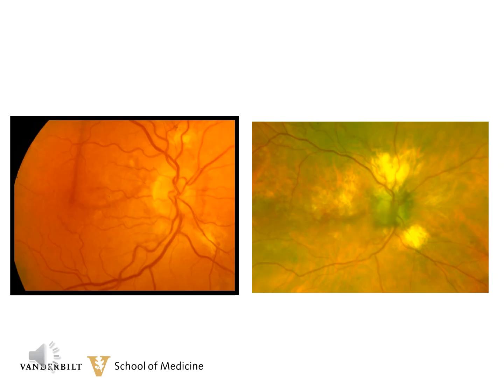So here is the initially asymptomatic eye. The photograph on the left is the baseline, when the vision is 20/20. Within several years, however, she developed a choroidal neovascular membrane in the right eye. And she's now had monthly injections for close to 10 years, and the vision's remaining at about 20/70.